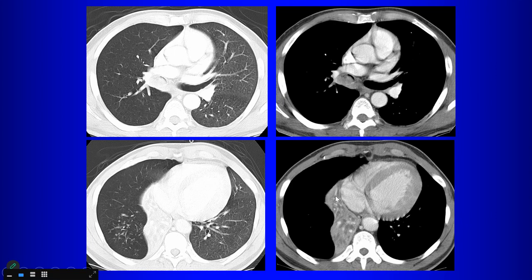Here's your atelectasis of the right middle lobe. Here's the atelectasis of the right lower lobe. What are these low attenuation things? What are those? Yeah, so that's mucus plugging of the small airways because there's obstruction here. So the secretions can't get out. So you're looking at mucus plugging here of the small distal airways.